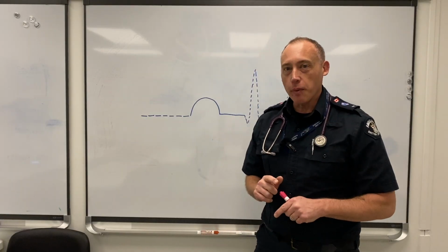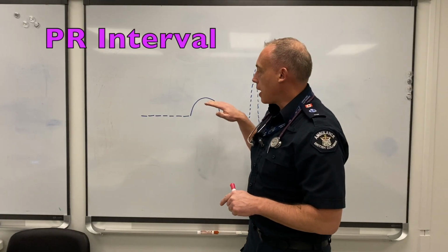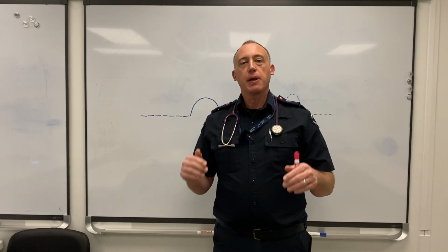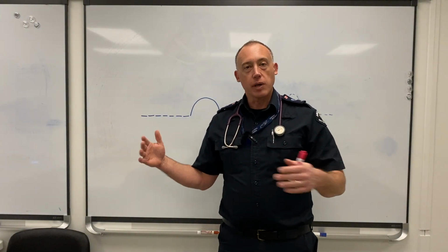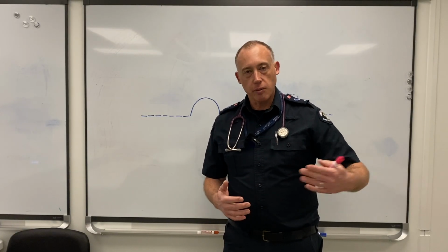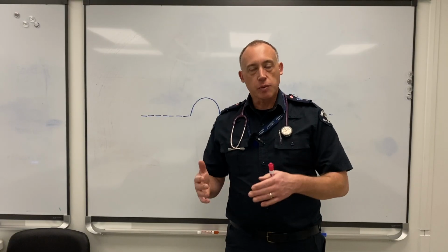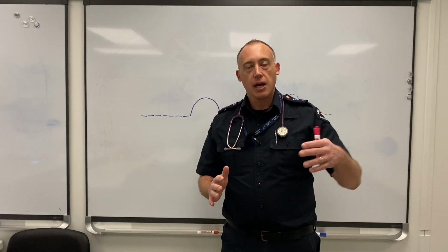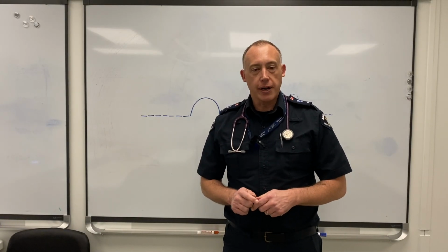So today what we're going to talk about is the PR interval, or the PRI. You might see it shorthanded, but the PR interval is just a measurement that we look at on the ECG that helps tell us some stuff about the patient's condition, which we'll get into a bit later. But since we're just going through the PQRST and the basics, I'm just going to show you what the PR interval is, and then this will start to relate later on.